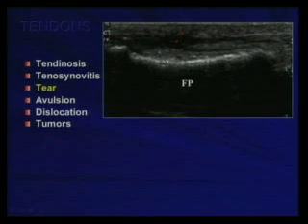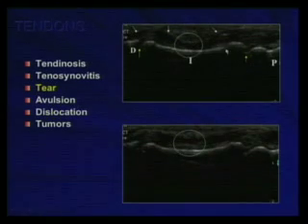We can also see tears. This is the proximal phalanx of the thumb, and you can see here the FPL, and you can see in this area in the longitudinal view the tendon stump. Sometimes in the finger, this is common in the fingers, you have a lot of fibrous tissue, and you will see some fibrous tissue interposed in the gap and may simulate a normal tendon, like in this case.